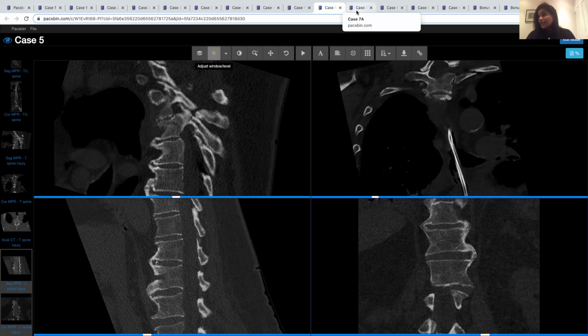And the key learning point with this is that the fused spines in patients with DISH and ankylosing spondylitis and other fused spines are prone to getting fractures even with trivial injury. So don't take a chance, have a low threshold to MR in these patients. They can often be difficult and not clearly conspicuous on initial CT imaging. So it's often a good idea. And sometimes you may just see an anterior widening of the anterior intervertebral disc space, and they've got significant discal injury on MRI.